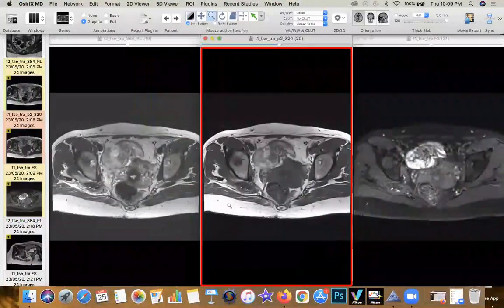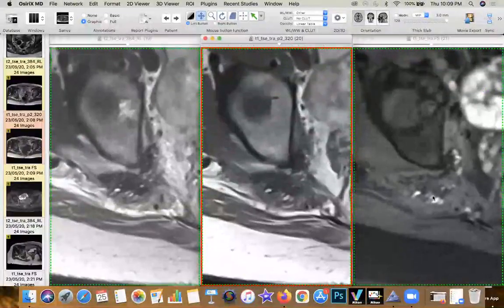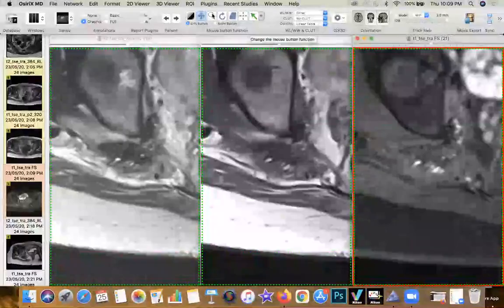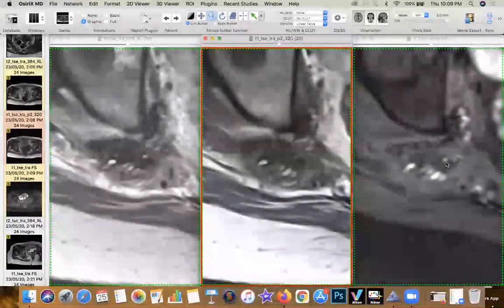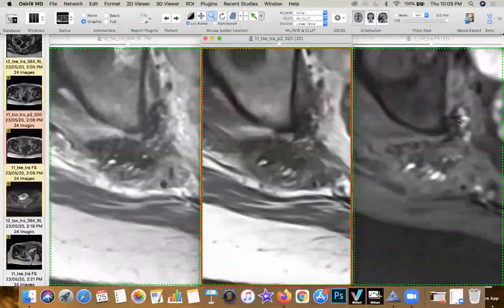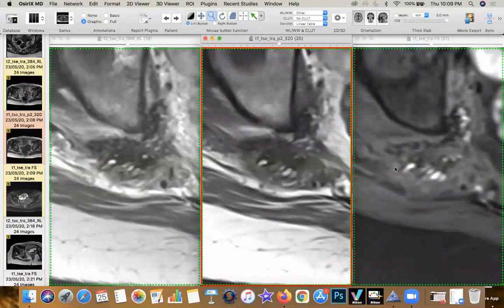And on the T1 weighted fat suppressed sequence obtained before giving contrast, you can now see that all those areas which are bright on the pre-contrast T1 are not getting suppressed on the fat suppressed sequence. So these all represent hemorrhage. And this is a combination of both active and non-active chronic fibroinflammatory desmoplastic cicatrization, which has occurred due to the presence of recurrent bleeding in endometriotic tissue.